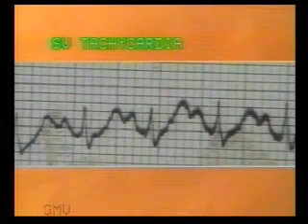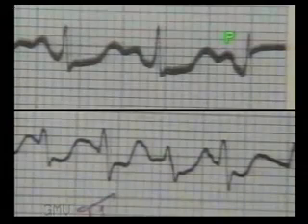In this ECG, the RR interval is 8 millimeters, so the rate is 186 per minute. P waves are present. The QRS complex is normal. So this is paroxysmal supraventricular tachycardia. To put it in very simple words, only when the RR interval is less than 10 small squares, call it a paroxysmal supraventricular tachycardia.